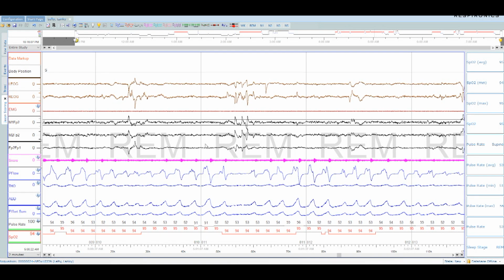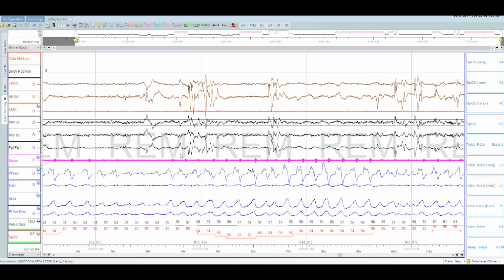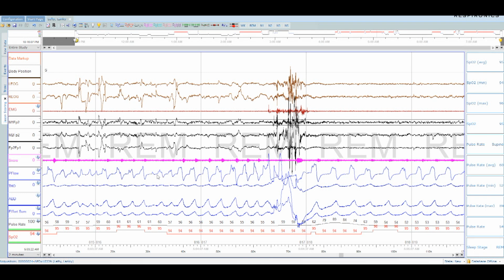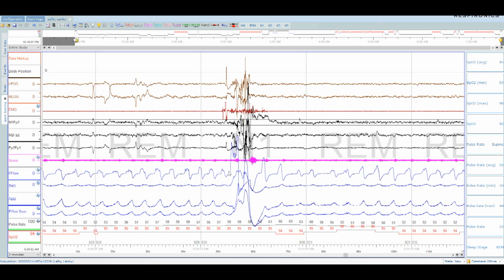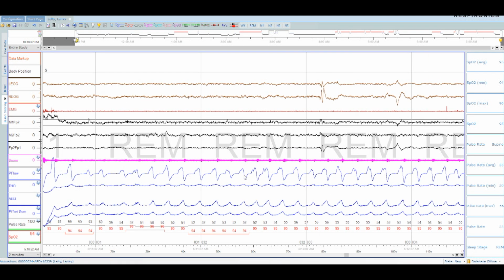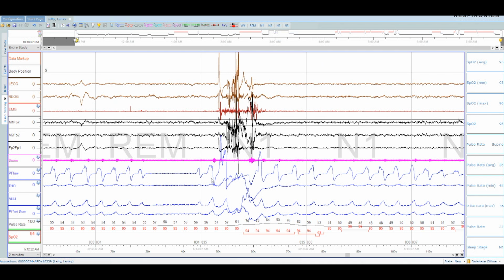I'm teasing. Usually the numbers, like you'll see spots that look terrible, but the report will show otherwise. Look, I'll be frank with you. Both nights I woke up, I felt pretty damn good. So you see this, like the snoring, I'm pretty convinced this is snoring. You see the snoring get bigger as breathing increases, leading up to arousal. We have a desaturation here, oxygen of 2%. So this is a pretty good indicator that that's very likely a RIRA. What I was saying is the report, though this looks bad, the report you'll see they're probably very minimal throughout the whole night. Because look, as I'm toggling forward, this is like 2-3 minutes.